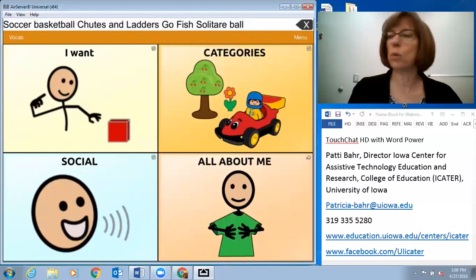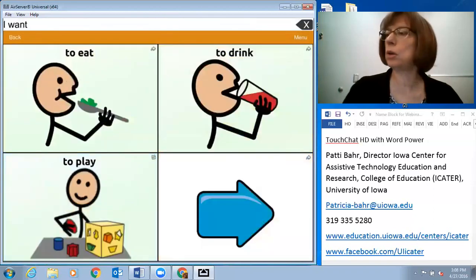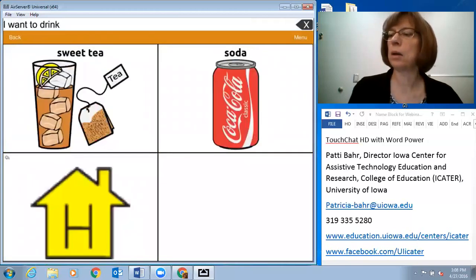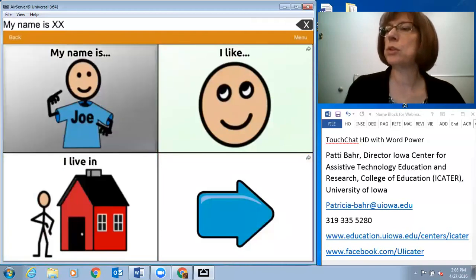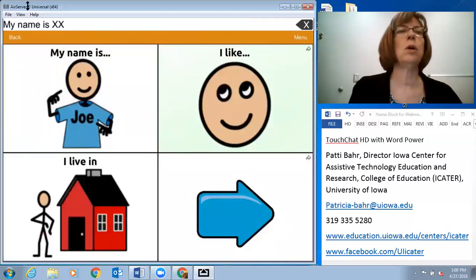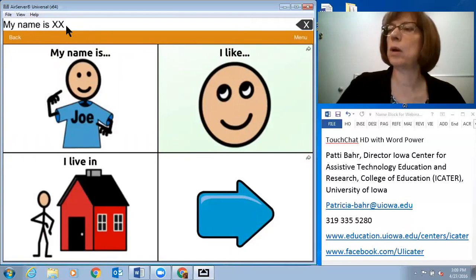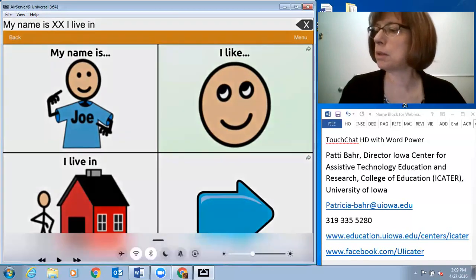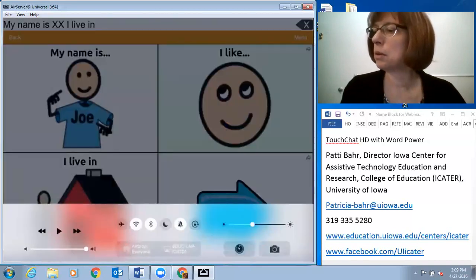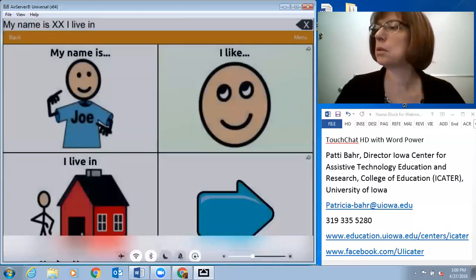So you can press one of these keys and it's going to branch. It'll branch again. You can go back. You can go to home and all about me. So just different things, and when you press up in here is where it's going to talk. And for some reason, it's not talking. It's been talking all day. And I bet it has to do with some of my settings here. So my unmute, mute is on, mute is off, lock on and off. Let's just see what that does.